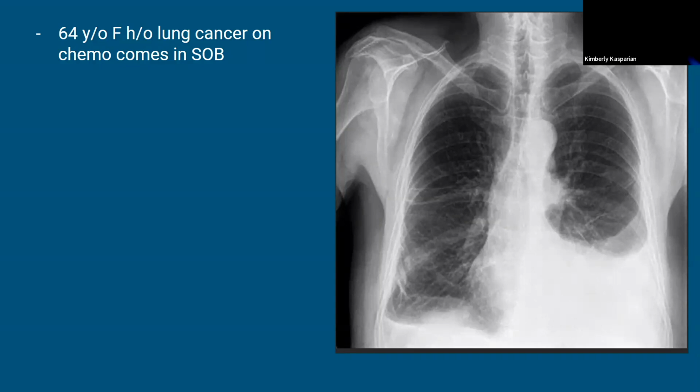All right, so if you're looking at this, you're totally correct. There's a large left and small right. What delineates large, medium, small, extra medium, petite? What sizes of pleural effusions? What makes you say this is large, that's small? Is there a cutoff or anything? Yeah, no, it's like edema. It's totally arbitrary, depending on how big you think it is.